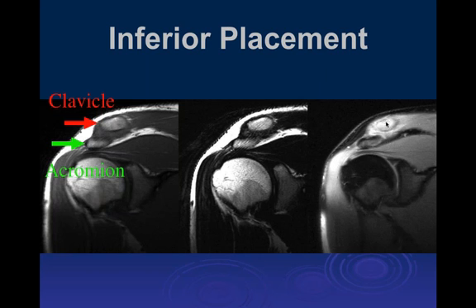What we found is edema around the AC joint is extremely common in both symptomatic and asymptomatic individuals. There really wasn't a good statistical correlation between bone marrow edema in the distal clavicle and actual symptoms of AC joint disease because it was so common in asymptomatic individuals. So that's just something to be a little bit aware of. Symptoms tend to be associated with marked irregularity of the subchondral articulating surfaces and if there is instability or displacement of the AC joint.